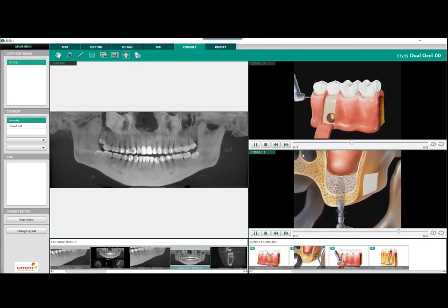Well, some of the questions I get is, can I export these windows or these videos? And they are proprietary to the software. So that is something that we are not able to do, is we cannot export those tools there.